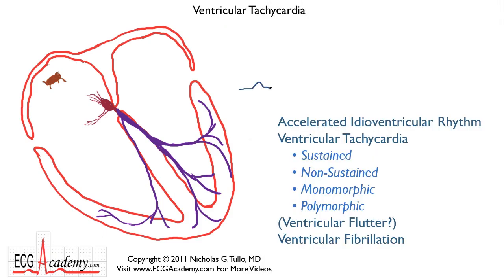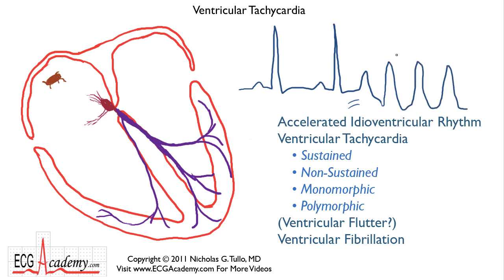Well, remember, if you're looking for ventricular premature beats, you expect to see the ventricular beat start without a P wave in front of it, or you may see a P wave, but the PR interval will be too short to have conducted. And the ventricular tachycardia will get started, and it will look distinctly different from the underlying complexes because it's following an abnormal course through the ventricular myocardium, not using the Purkinje system for the most part. Pretty easy to recognize. It's the kind of thing that creates a sense of panic when the nurse looks at the monitor and yells, VTAC!